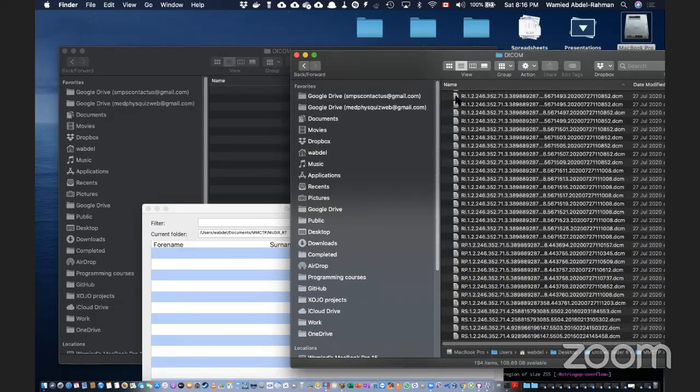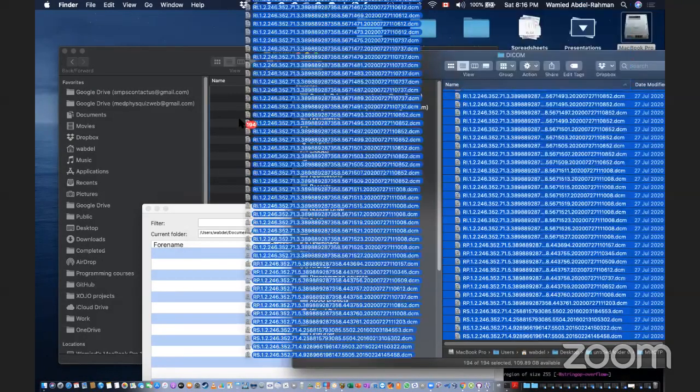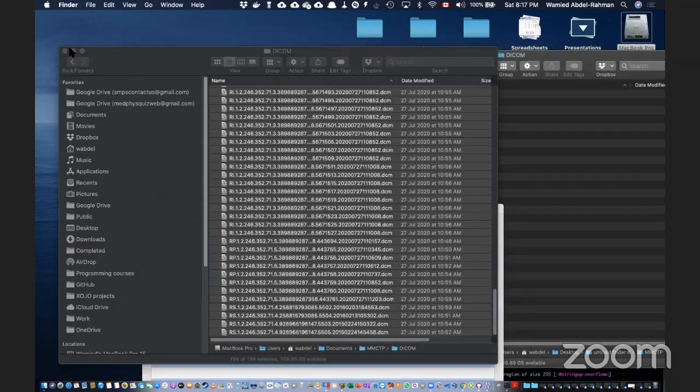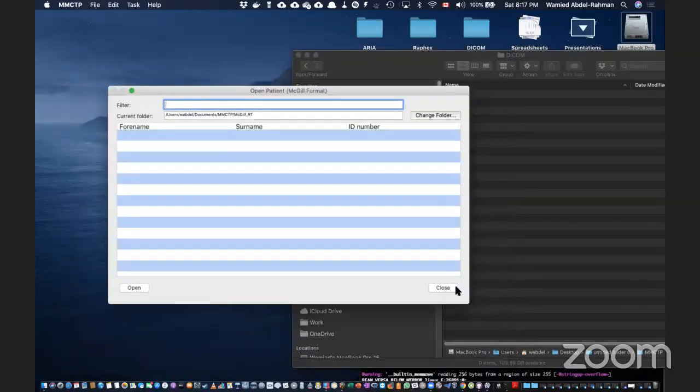So in Eclipse, I exported DICOM with DICOM RT and with the structures. EGS alone you cannot have structures there. So those XYZ view, you don't have structures. If you don't have structures, you cannot actually generate DVHs. So I put them back in the DICOM folder.